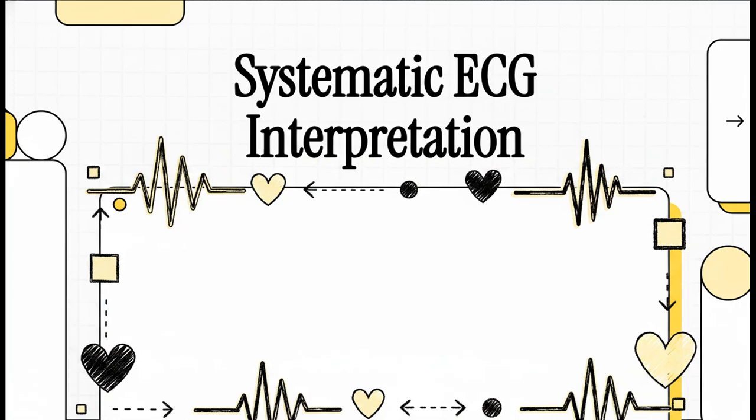Welcome! Let's talk about the electrocardiogram. You look at that tracing and it seems like just a simple line going up and down, right? Well, in reality, it's an incredibly powerful window into the heart's electrophysiological function. To really understand what it's telling you, you can't just guess.